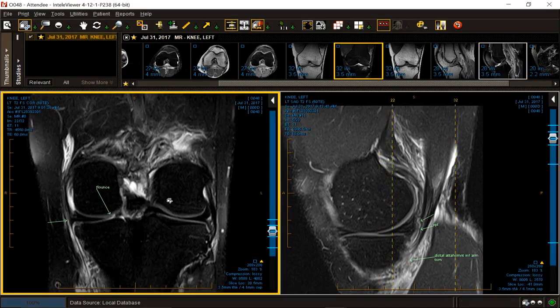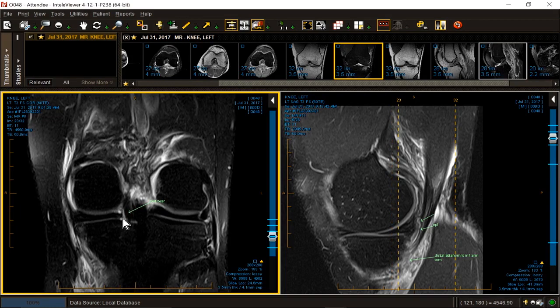One of your colleagues also pointed out that there was some extrusion or displacement of the meniscus in the coronal projection, and at first glance during the break I thought, well, maybe there's a little tear there, but there's not. There is a tear, however, right here, right at the junction of the ligament, the root ligament, and the meniscus root. So that's allowing the meniscus to migrate out medially, and it's the posterior semimembranosus corner injury that's allowing the meniscus to migrate out posteriorly, and this will be worse in knee flexion.